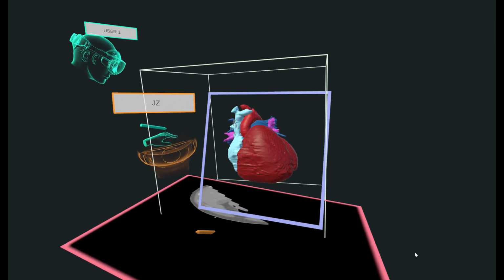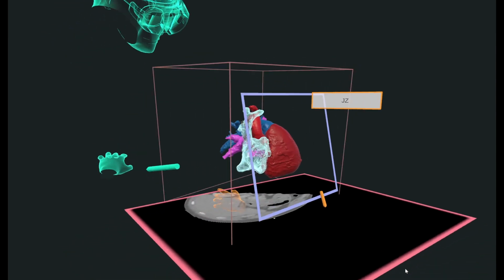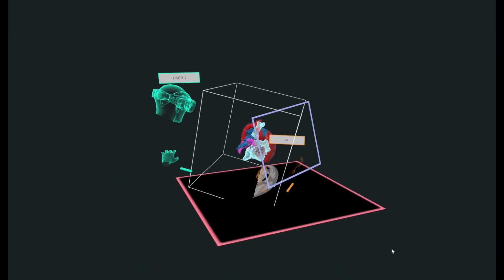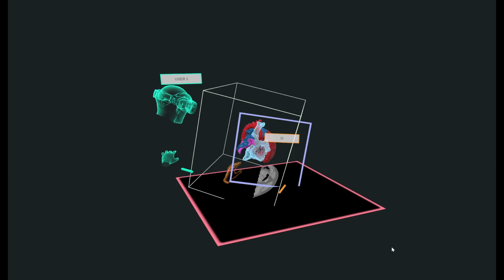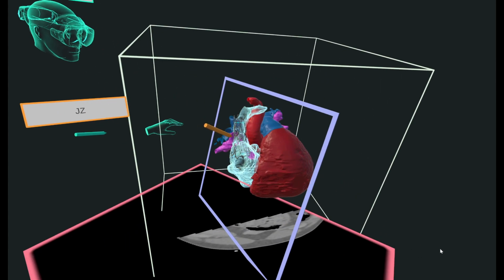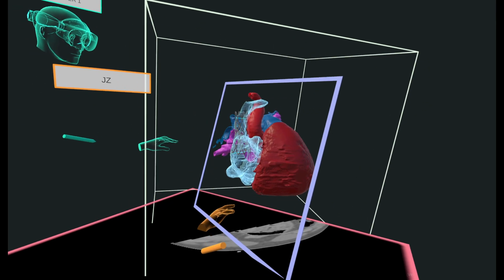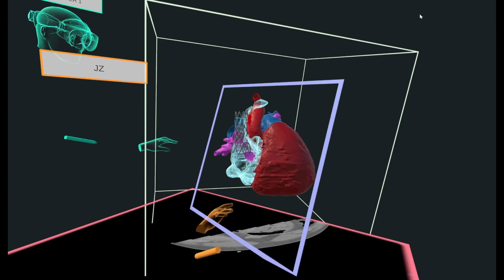I like the transparency. Can we show that for the right atrium? There we go. That's a nice way of seeing that and having the anatomy and highlighting that part in the anatomy there as well. This is just very nice to learn, especially for our trainees, how those veins are going to be baffled with that stent and when we have to make sure that we're protected and we don't compress. That's why we need to have pulmonary vein protection in many cases.